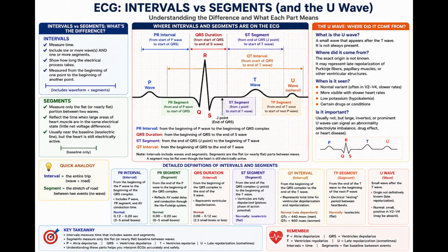ECG intervals, segments, and the U-wave. Introduction. This video will clarify the difference between ECG waves, segments, and intervals. These terms are sometimes used interchangeably, but they describe different parts of the ECG tracing.